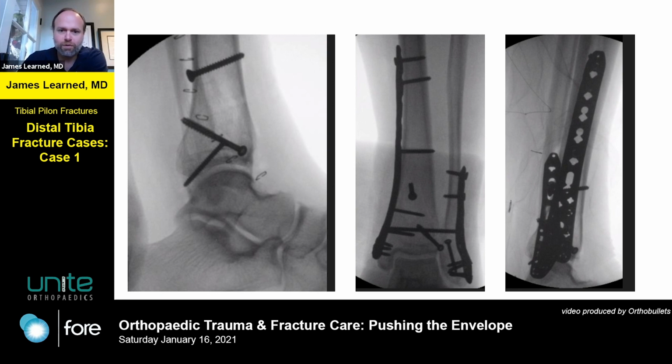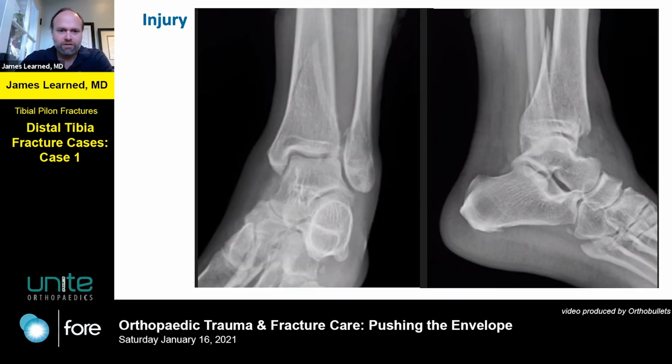longer screws in the midsection, and then nice bicortical 3.5 millimeter screws approximately, well reduced on the lateral, on the AP. And then because of the fibula fracture and some intraoperative stress exams showed instability of the syndesmosis, they've also got an interosseous screw here. We could probably talk for about 7 days on whether people would use a screw or flexible fixation these days, but I think we know that this is reliable and a really nicely reduced and stabilized injury. So here's some follow-up films.